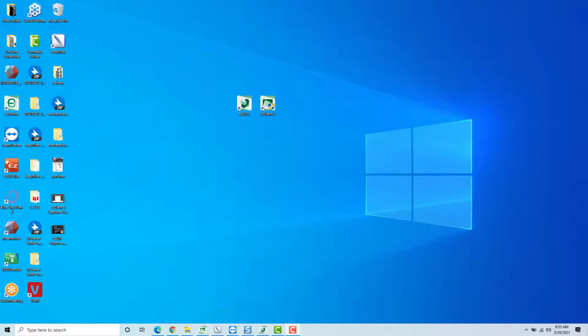software introduction. Today we're going to look at EzDent-i, Ez3D-i in preparation for utilizing the software and getting a greater understanding. Here you can see I'm on my desktop. We have two icons. We have our EzDent-i and our Ez3D-i.